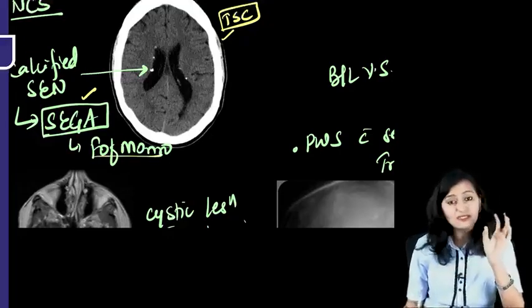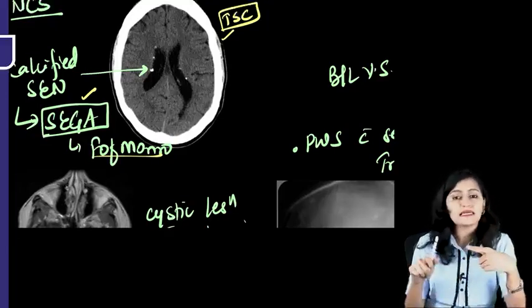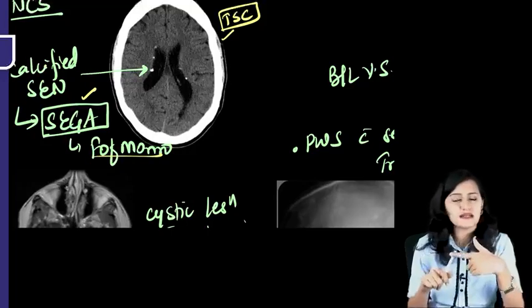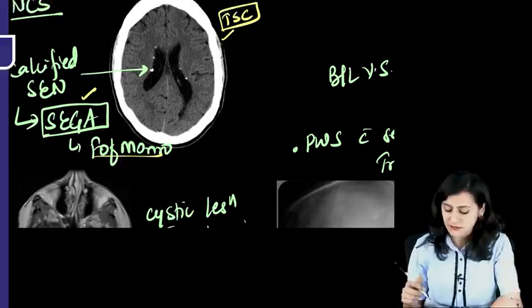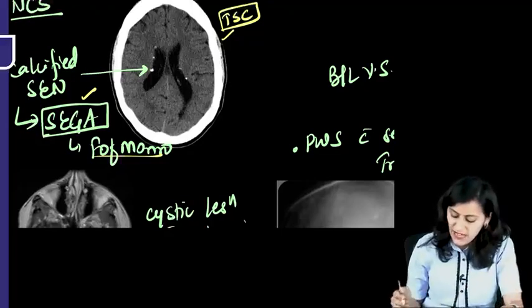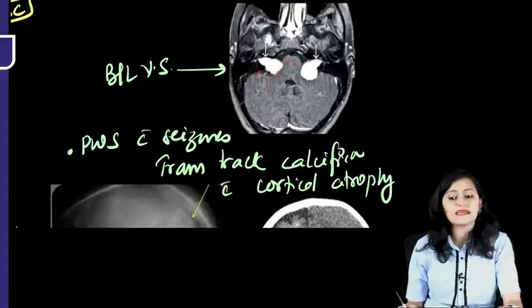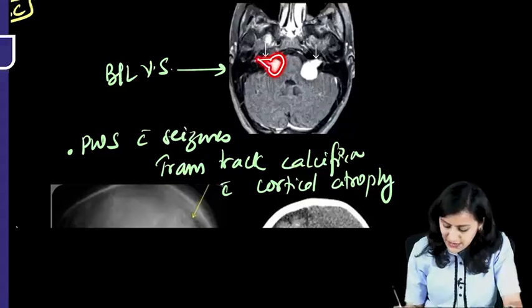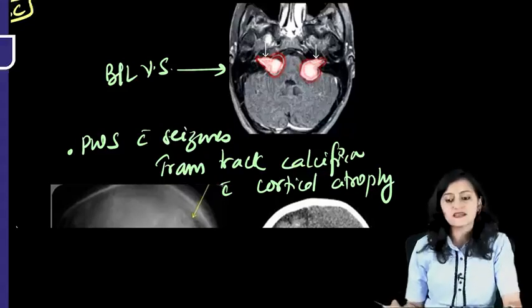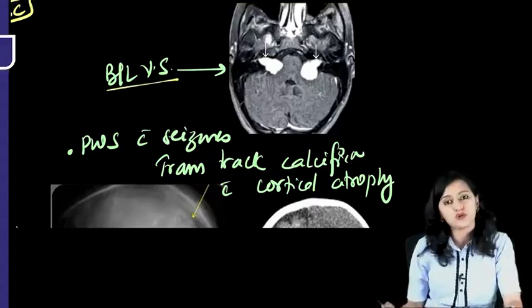So remember, tuberous sclerosis is SEGA. In tuberous sclerosis, the heart has cardiac rhabdomyomas, kidneys have AML, cysts, RCCs, pancreatic cysts, and LAM in the lung. All these are the features that we see. Next one, when we have these tumors here in the cerebellopontine angle, between the pons and the cerebellum, bilaterally, showing this ice cream cone appearance, this is suggestive of vestibular schwannomas.